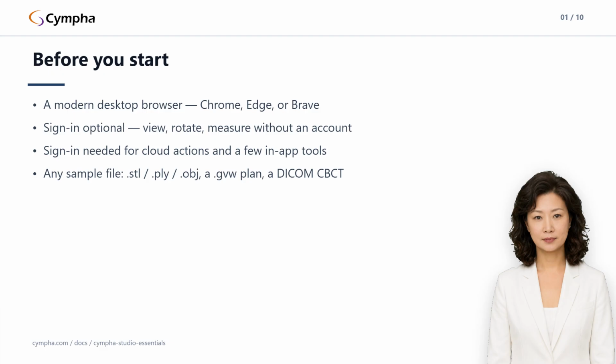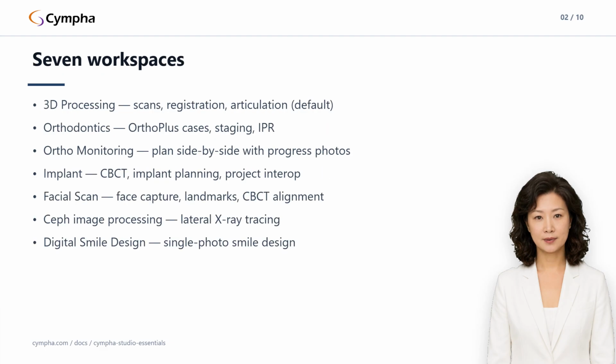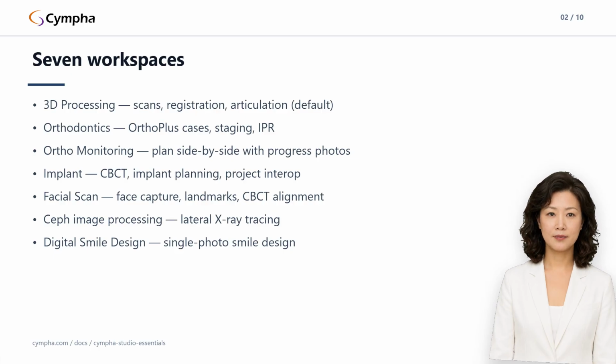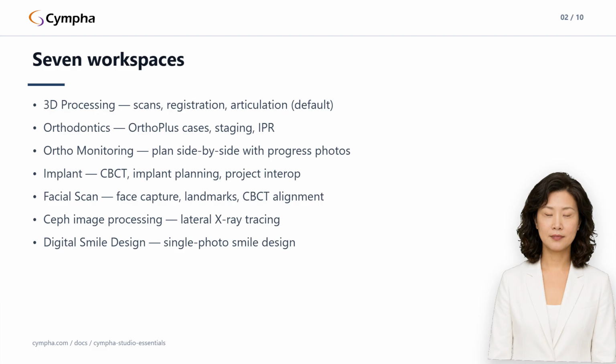Open Studio, Cympha.com, and you get an empty 3D scene with a small navigation strip on top. At the top left is the workspace switcher, and Studio has 7 workspaces. 3D processing, optical scans, mesh viewing, registration, articulation is the default. Orthodontics carries OrthoPlus cases, tooth staging, and IPR. Ortho monitoring plays a treatment plan side by side with the patient's monitoring photos taken at each step. Implant covers CBCT loading, implant planning, and implant project interop.